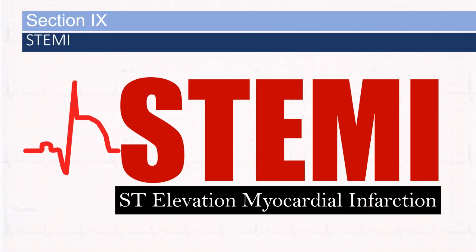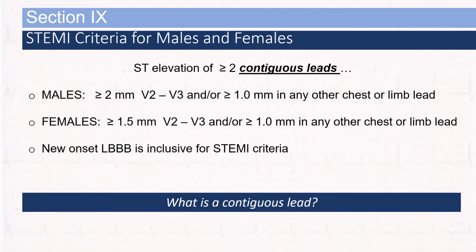You've all been waiting for it. The big event. Determining STEMI, ST elevation myocardial infarction. These are the STEMI criteria for males and females. Note the new onset left bundle branch block, which is also inclusive of STEMI criteria.